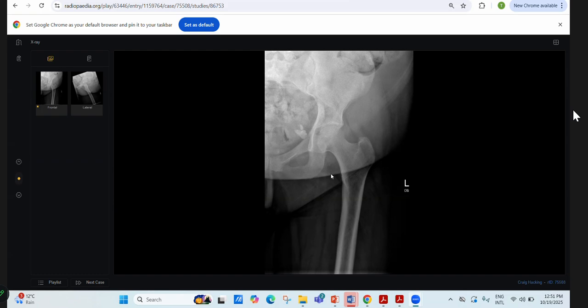So, can I have the history of this patient? Patient presented with pain in the left hemipelvis, so they had an X-ray first. Okay, so ma'am, it's a 30-ish, late 30s age of the patient. Okay, I mean, this is a young patient. Ma'am, other than that, I would like to see the other orthogonal film if available.